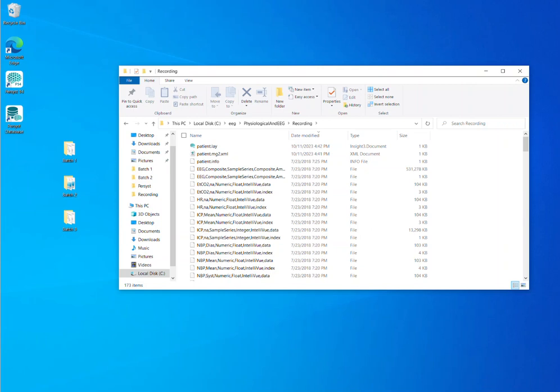In this screencast, we're going to look at some ways of processing data. This happens to be for a Moberg EEG recording that has both EEG and physiological data, exporting that data to CSV, getting some of that in a higher resolution than would normally be done for CSV data, and also batch automating some of that processing as well.